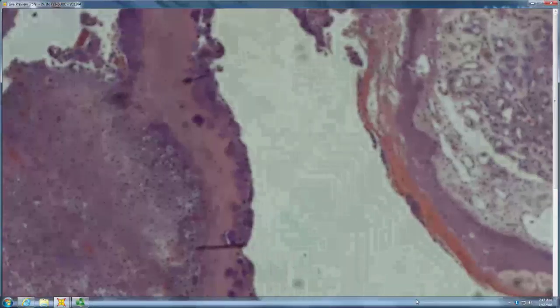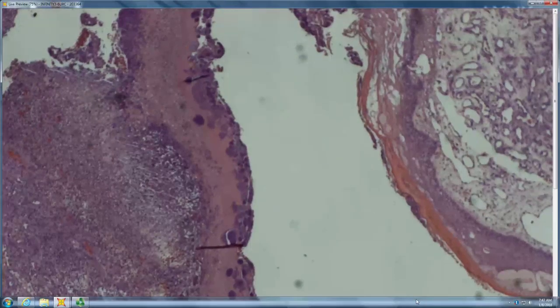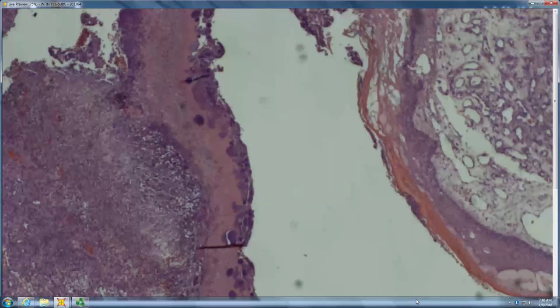Could be bacterial colonies. What bacteria forms large clusters? Staph. Right. Botryomycosis is if it's draining out of a sinus tract. This is what an impetiginized crust looks like. An impetiginized crust just has these huge staphylococcal colonies. If you have similar colonies coming out of a sinus tract, that's botryomycosis. So staph forms huge grape-like clusters. So that's granulation tissue there? No, there's a PG. PGs become impetiginized dime a dozen.